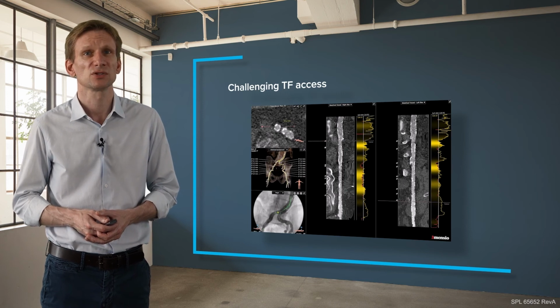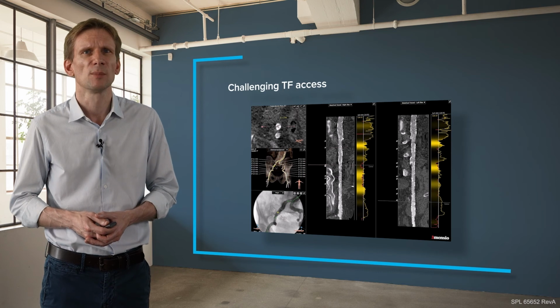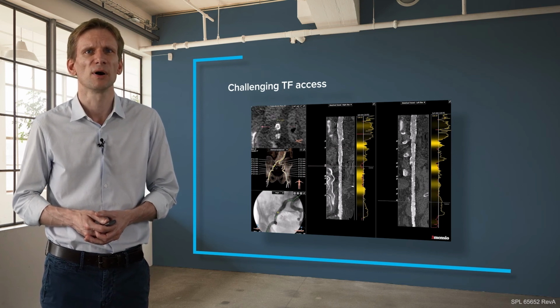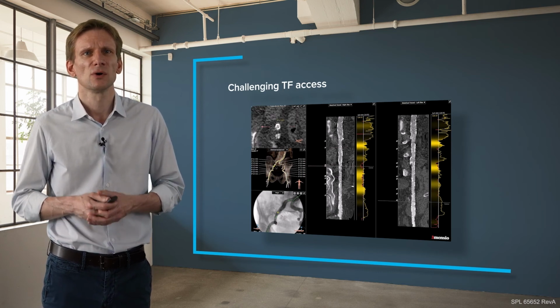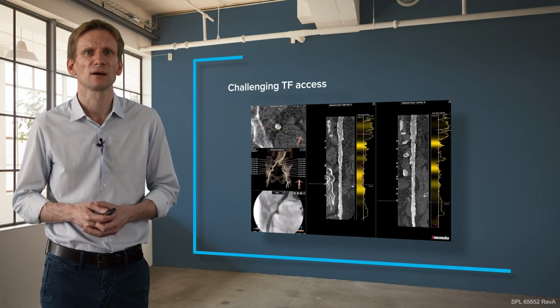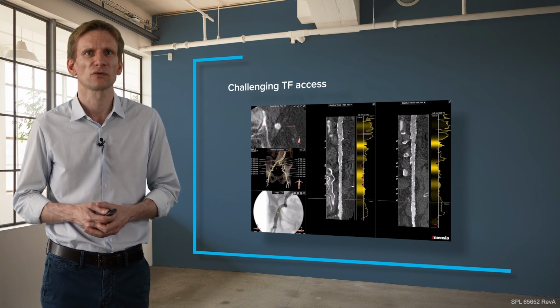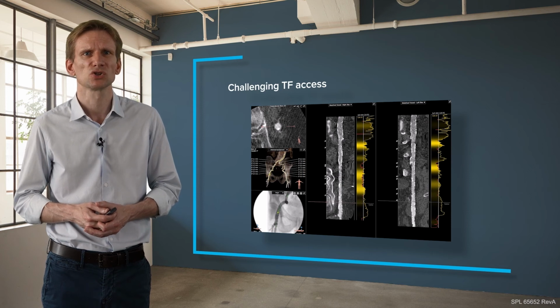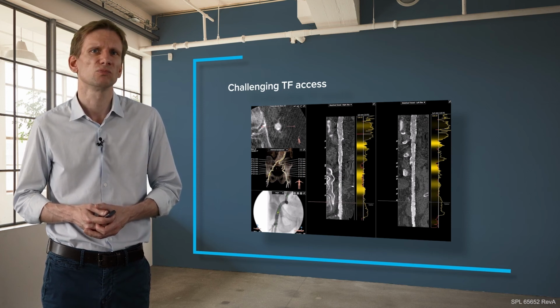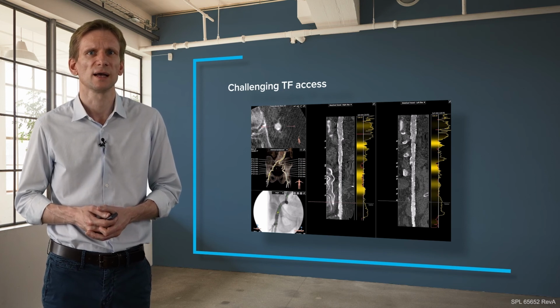So you see severely calcified, also 360-degree calcified, but luminal diameters which stay above 4 millimeters. So we assess this as almost routine IVL, a good case for IVL-assisted transfemoral TAVI. The access site, of course, is also an additional concern, but still there's calcium, but mostly posterior. So we think this won't probably give us too much problem to close this vessel at the end.